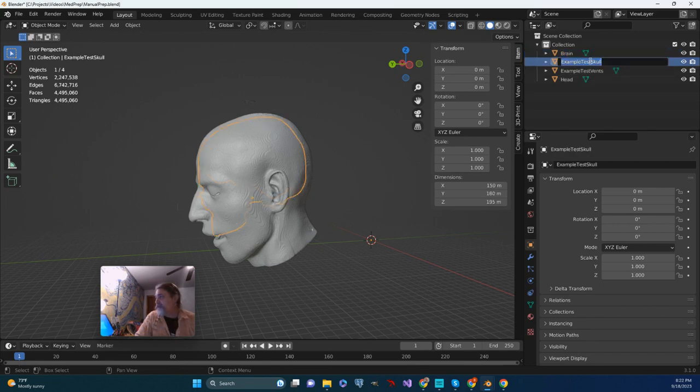And I'm just going to go with the basic names: skull, head, etc. I think in the case of vents, I'm going to change that to actually call that ventricle, right? Yeah, VENT. Yep, I can spell. And then I'm going to leave it at that. I'll come back around in a few moments to deal with the more detailed items.